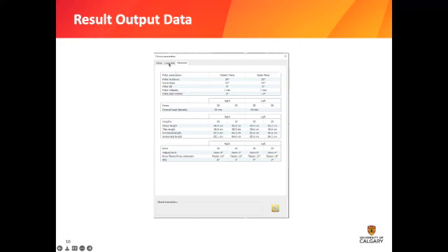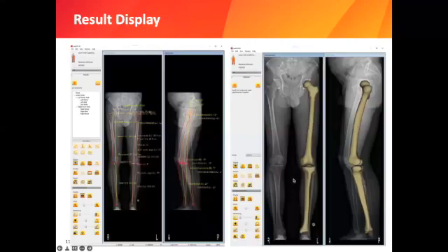You can also click the lower limb button here, which will allow you to select more parameters or less parameters if you're wanting to streamline it. And then when you're ready to export to Excel, you can click this button. Now there is a folder on EOS that summarizes all of the Excel documents. However, if you are doing more fine-tuning analysis for your specific project or thesis, it might be worthwhile to create your own folder separate from this. That way you can collect all the files in one space.